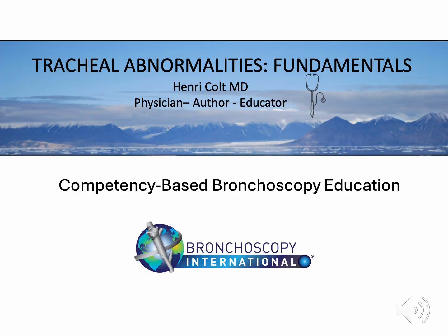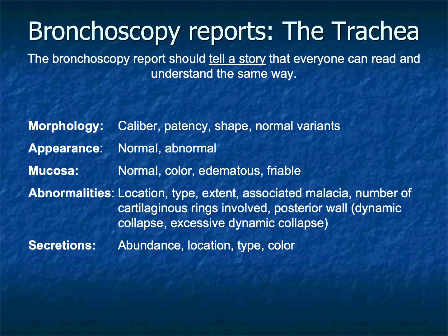In this lecture, we will review common tracheal abnormalities encountered during bronchoscopy. We will focus on systematic airway evaluation, recognition of important morphologic patterns, dynamic abnormalities, benign and malignant lesions, and the terminology required to communicate findings accurately in the bronchoscopy report. Every bronchoscopy report should tell a story that different readers interpret in exactly the same way.